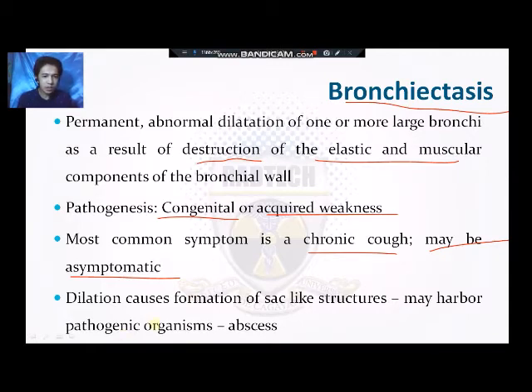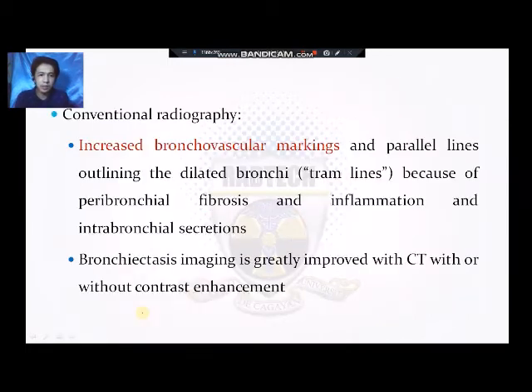Okay, dilation causes formation of sac-like structures that may harbor pathogenic organisms or abscess. So basically, the bronchus of the patient can enlarge, no? And then because of that enlargement or because of that dilation, daghan kayo bacterial formation ang pwede nga magpuyo dito sa iyang site. So that's why later on dayon it may cause infections.